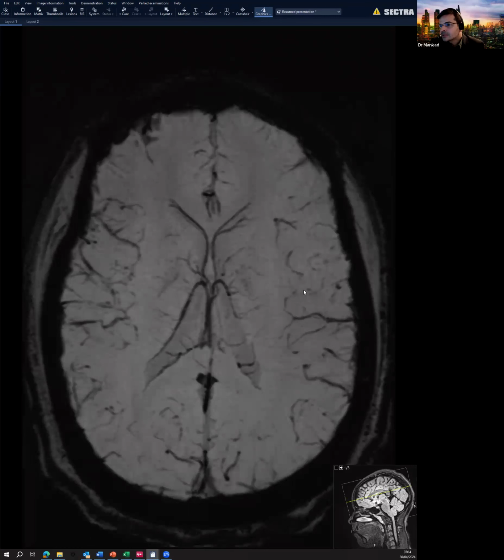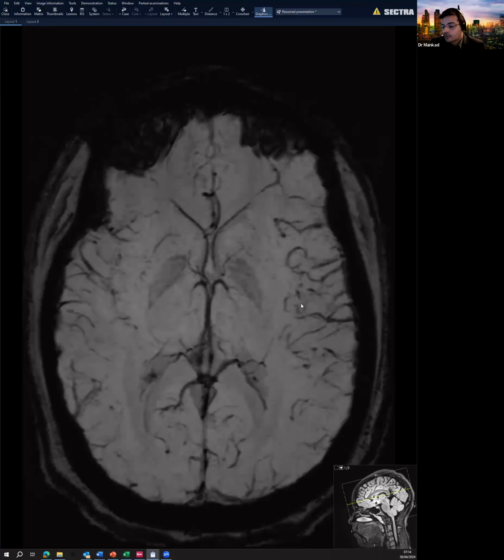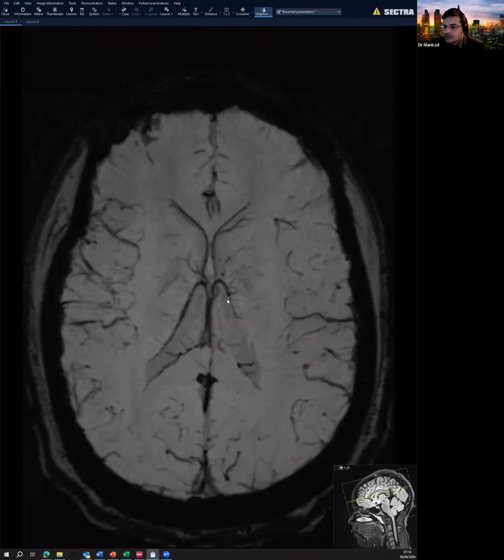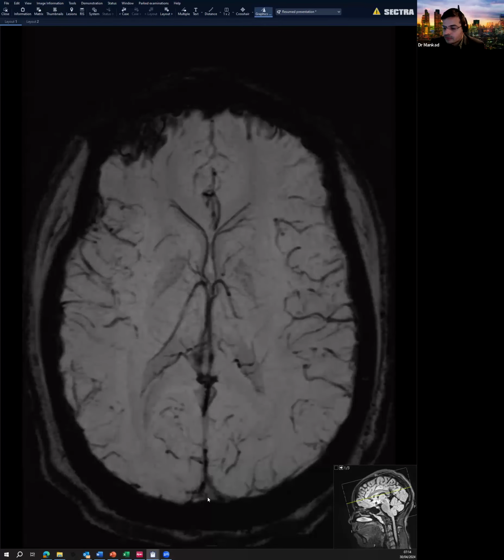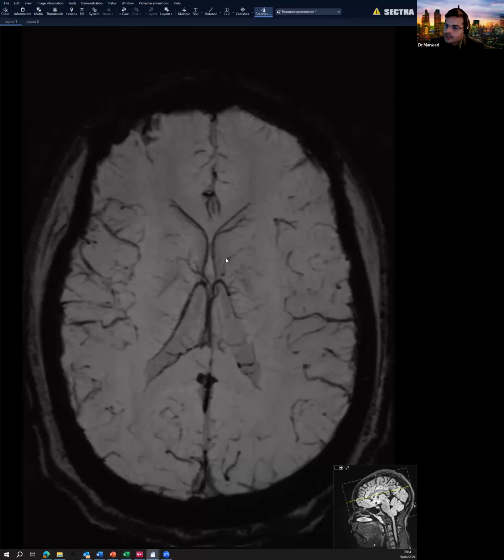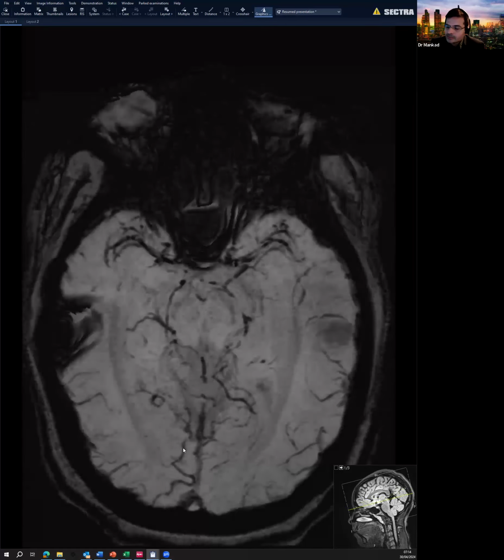The susceptibility weighted imaging shows you a lot more anatomy than we were aware of. So we knew that we had the deep venous system. You can see the internal cerebral veins. You have the dural venous system and you have the cortical veins. But there is also a whole mesh of transmedullary veins going across. Of course, the arterial system here also is well depicted.